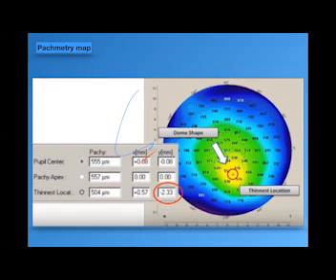But in correlation with the other one, they found that the difference in curvature between both eyes, and the difference between the pachymetry maps in both eyes, were out of the normal and accepted range, so they could diagnose this as a case of early keratoconus. So please study both eyes and correlate them with each other.